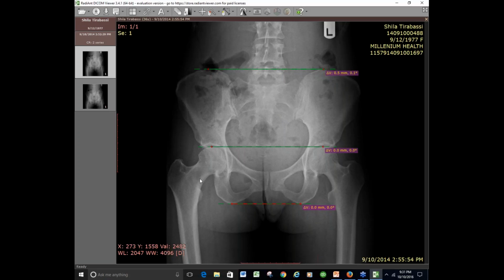And that was actually with just a shoe lift. We didn't do anything to her pelvis. Her pelvis didn't suddenly grow. It's because the angles are the same. Any questions on that? Because that is pretty demonstrative of why we need to look at angles and not actual measurements, because these two x-rays were taken just moments from each other. Her pelvis did not grow 5 millimeters in those moments, I'm pretty sure.